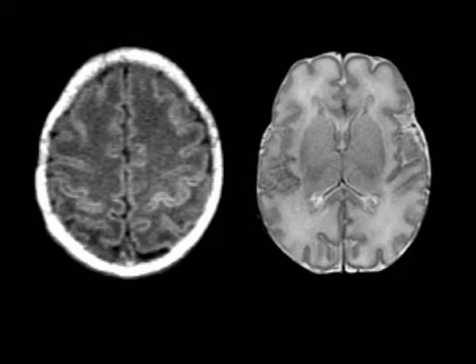So remember that you aren't born with a normally myelinated brain, and myelin is basically fat, so that's going to change the way that things look. When you're trying to figure out what a study is, and I'll repeat this throughout the neuro talks, first thing you do is look if you can see some CSF. Bright CSF is going to be T2. Dark CSF is going to be either T1 or FLAIR.